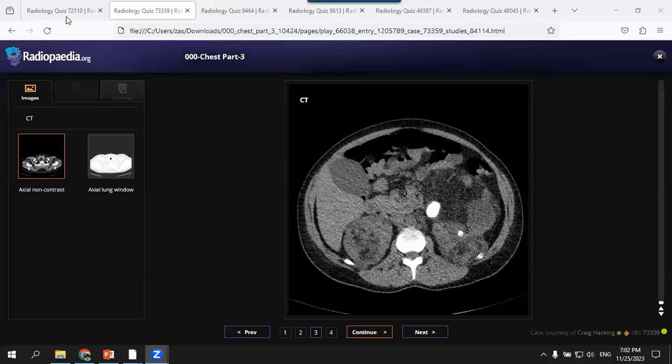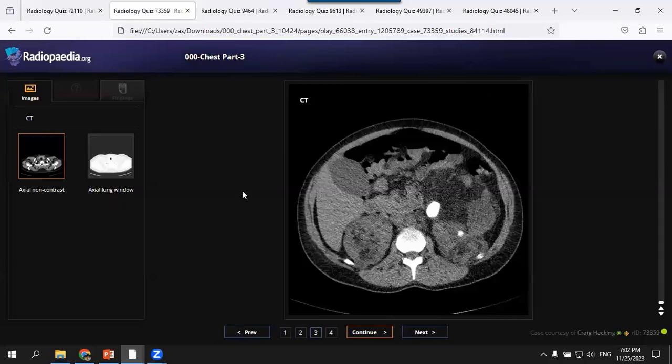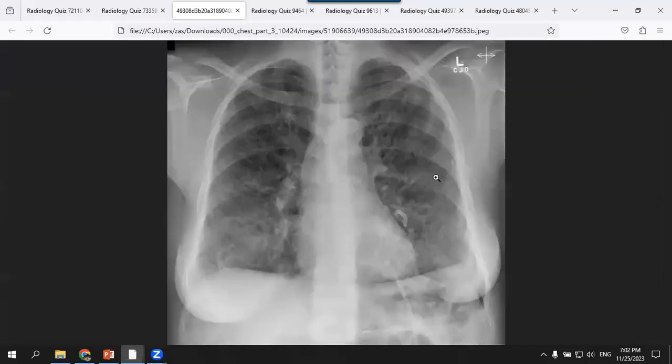Very good. So the first two cases of reticular pattern that mimics fibrosis, but lung volume is preserved, are Langerhans cell histiocytosis and lymphangiomyomatosis. But on zooming these images, you can see minute cystic changes. So the predominant pattern will be cystic, not reticular.